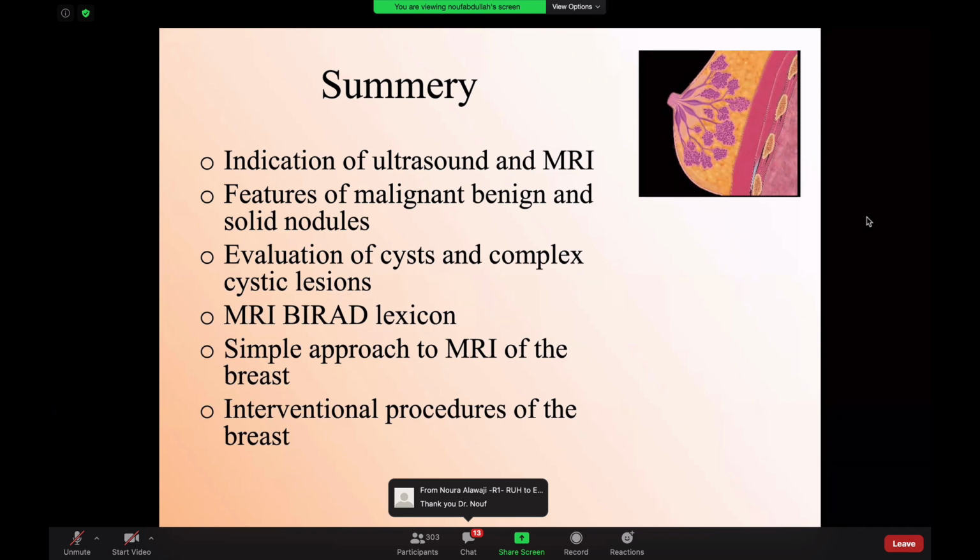Okay. The next question, is it necessary for all calcifications to have milk of calcium to consider it as bi-rads 2? That's a good question because, as we said, whenever you have a suspicious microcalcification, like grouped or segmental, we do a magnification view and a true lateral.